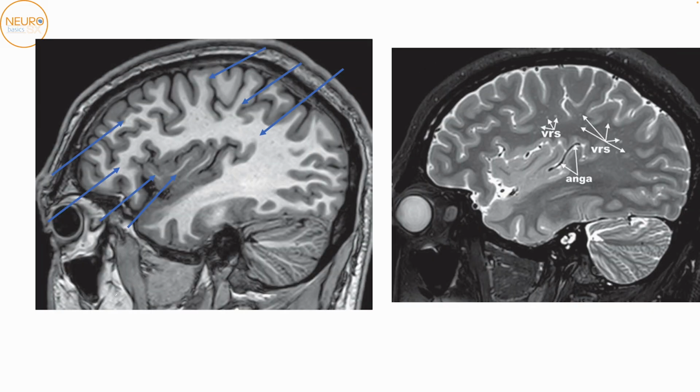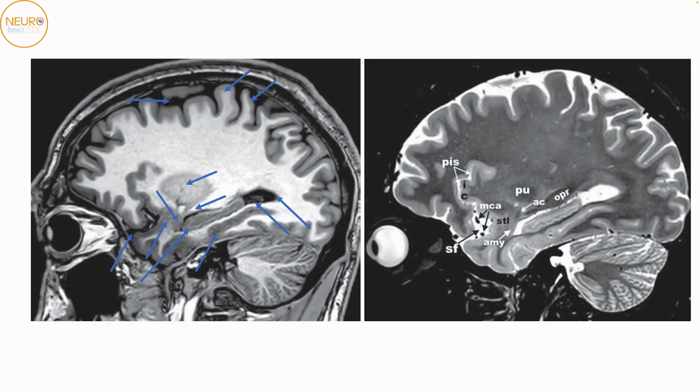In the next more medial cut, we're able to see the insula a lot more clearly. Now we can see the anterior short gyri over here and the posterior long gyri, which are present more posteriorly over here. Again, you can use a thick and thin rule to identify the pre and the post central gyrus. This will be the supramarginal gyrus over here. This is still the inferior frontal, and this will be the middle frontal gyrus over here.